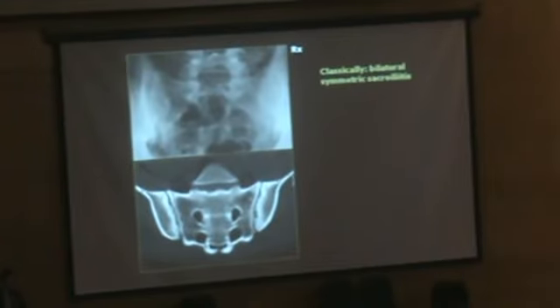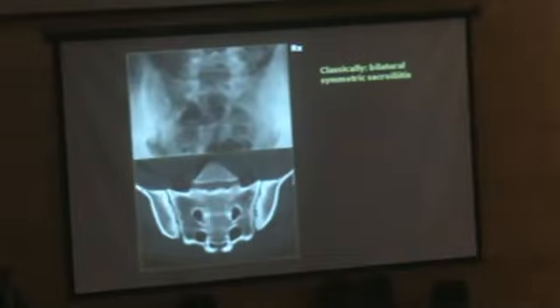This was diagnosed with X-ray when the pathology was already advanced. So we could see involvement in both sacroiliac joints. Now with MRI, we can see that it's not really like that. So this is classic, but it's not necessarily the truth, especially in the early stages of disease, and I'll show you examples of that.